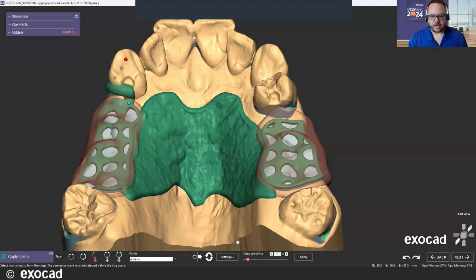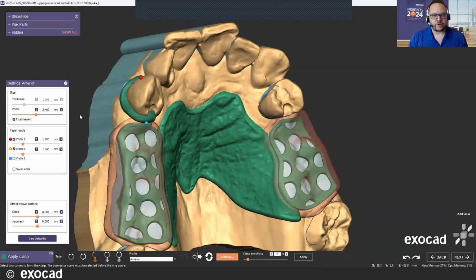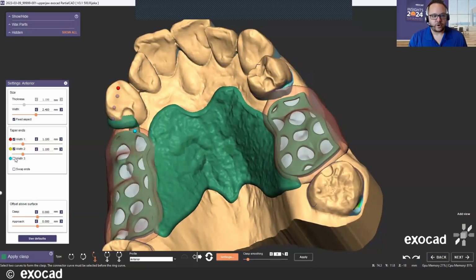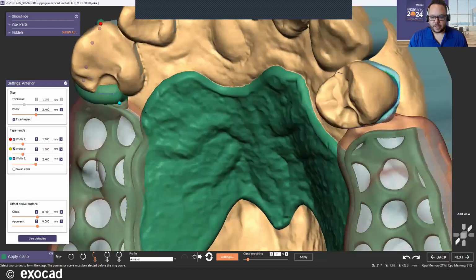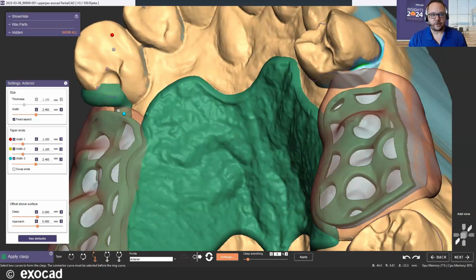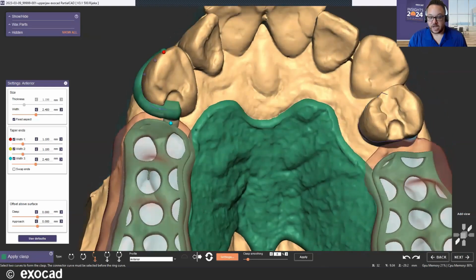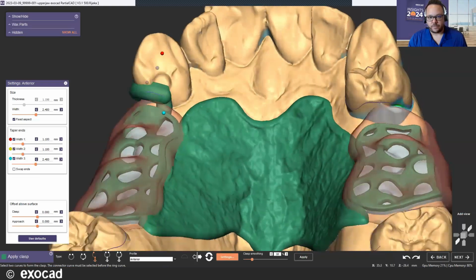So we'll go ahead and click that again, but on settings. So for taper ends, we did change the color orientation so you can see that each end has a different color. And then if you do a connecting curve, you can adjust that value as well. And then there's clasp smoothing. Sometimes when you hit different angulation of a refractory model, there might be a little bit of overlap or some areas of the clasp you'd want smoothed a little bit more. So as you adjust this, it's going to smooth that for you.